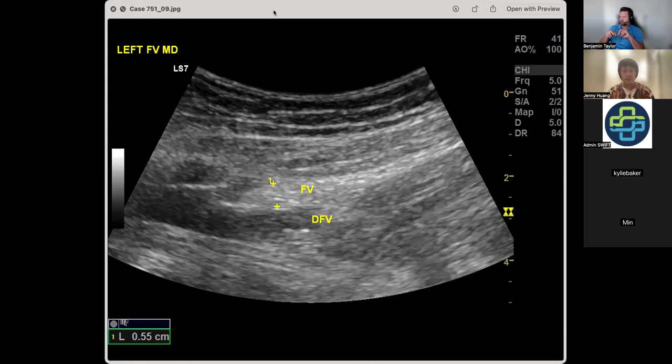Is it old? Okay. So there are things in the clot appearance. There's also things like, have they got development of collaterals and so on, which would suggest that there's certainly some old component. And of course, then you get the trickiest situation where have they got acute on chronic? So we know they've got a chronic clot, but now have they got acute clot on top of it? All right. So what's the easiest and most definite way to answer any of those questions? Check the old scan. Yeah, absolutely.